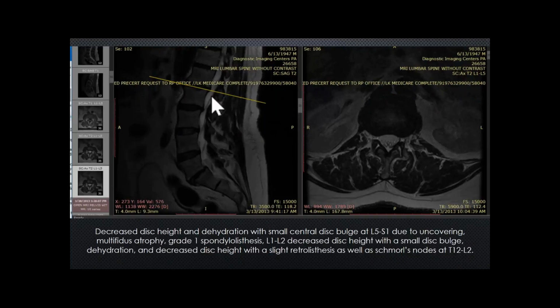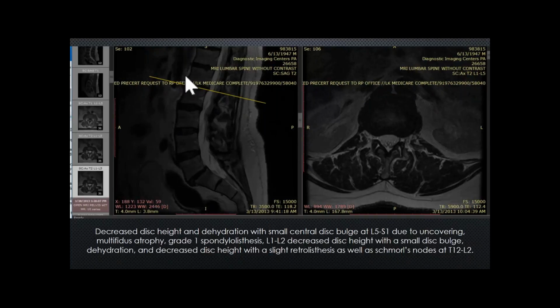and we see a slight bulge here with bone spurs out to the front, and then out in the back there as well, a slight bulge, which is harder to see here because of this writing they've got on this particular MRI. We can also see some end plate violation or end plate fractures here, or Schmorl's nodes.